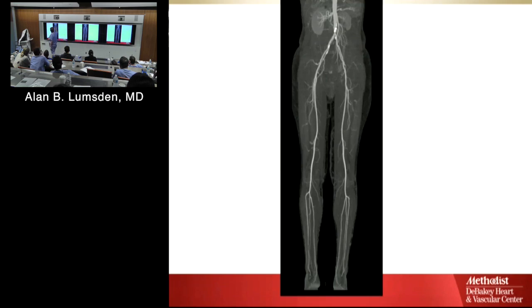Right at the middle of this thing. Describe that to me. What would you say? Just take it at face value and describe what you see. Heavy calcification. Yeah, above the bifurcation. Does it look normal or abnormal? Looks like it's got a stenosis in it. So if the patient had bilateral buttock claudication and walking 100 yards, can you account for it based upon that lesion?